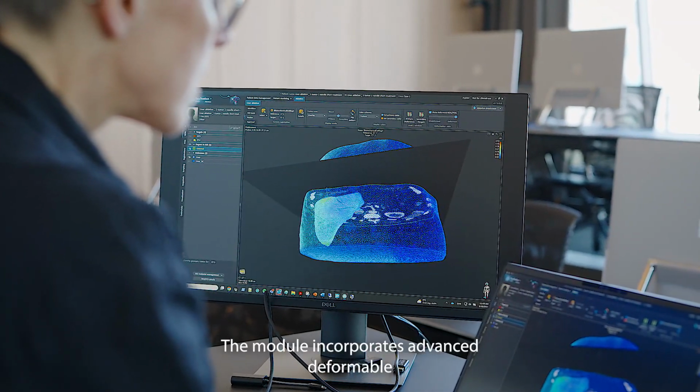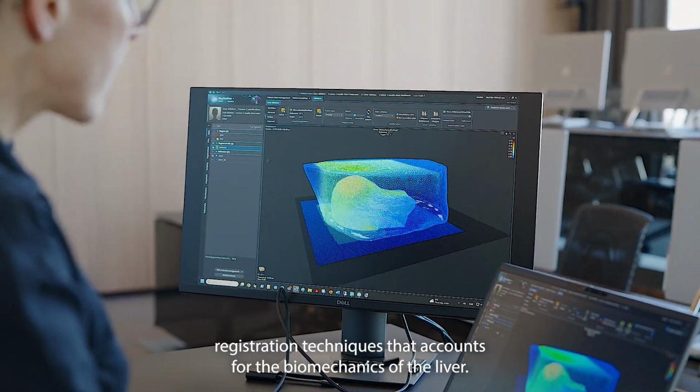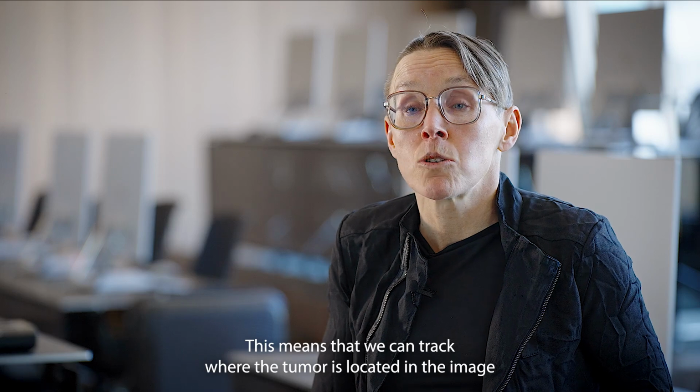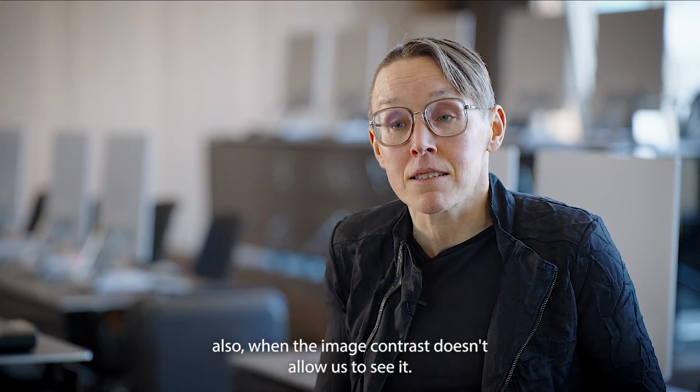The module incorporates advanced deformable registration techniques that account for the biomechanics of the liver. Unlike rigid alignment techniques, this approach adapts to the deformation of the organ. This means that we can track where the tumor is located in the image, also when the image contrast doesn't allow us to see it.